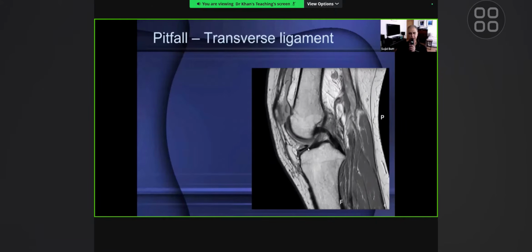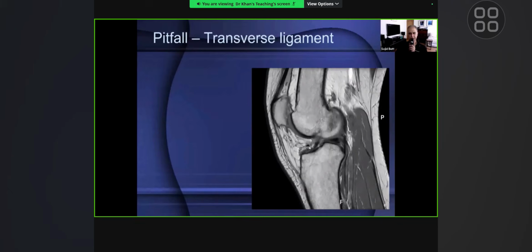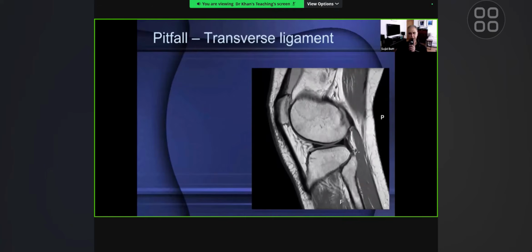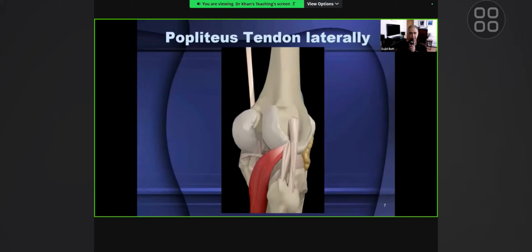We're traveling towards the lateral side, outer side, and we can see that there is this low signal intensity structure. And if you just look at the single image here, you can suspect that there is a tear of the anterior horn of medial meniscus. But if you follow it, you see that it actually gets communicated with the meniscus. And in the axial image, it is this structure which causes this confusion. And that's a normal anterior transverse ligament. It's not a tear.